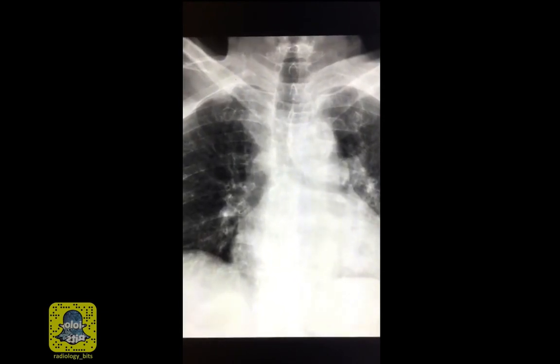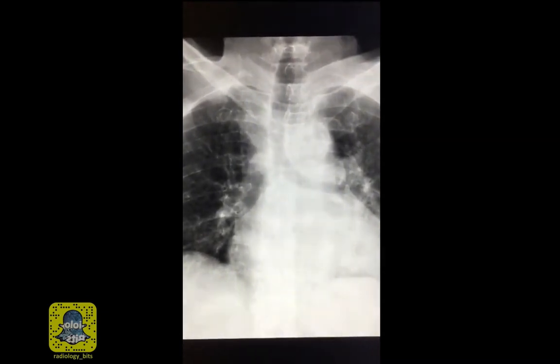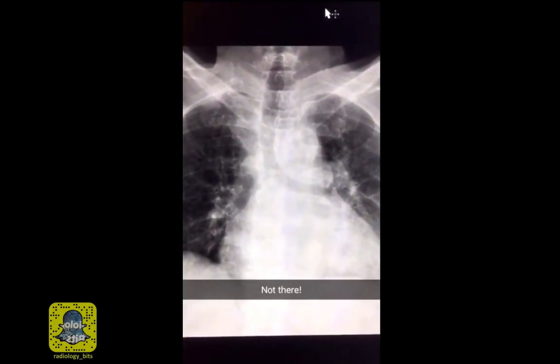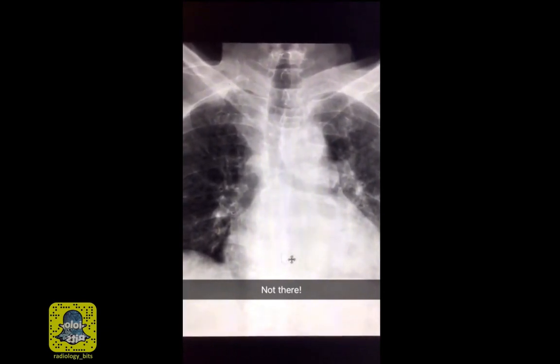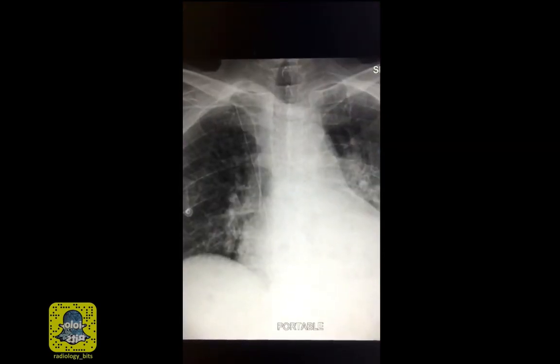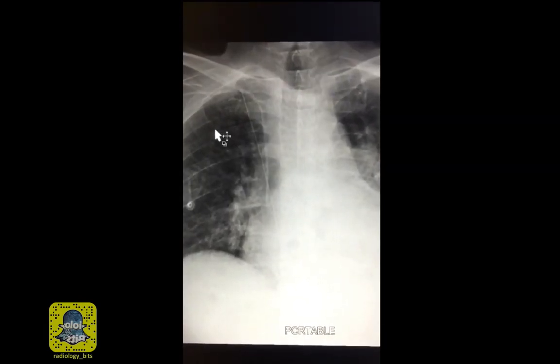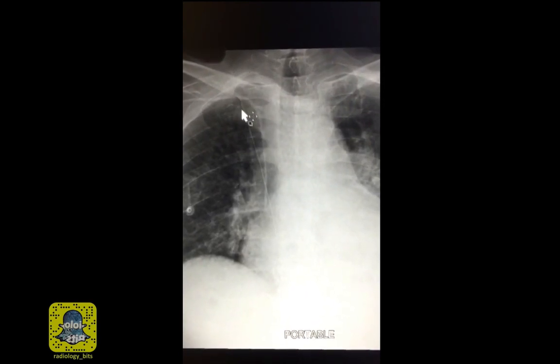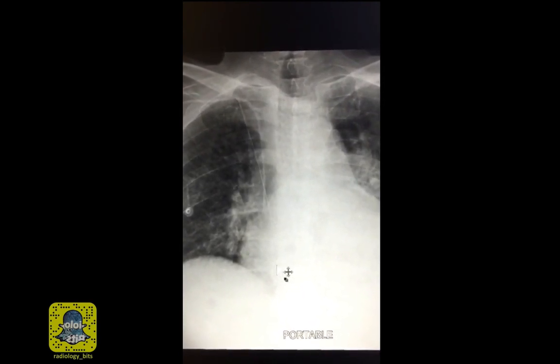To really understand what's going on, let's go back to the patient's pre-admission chest radiograph before he had pneumonia. This is his chest x-ray before he was admitted to ICU, and there are no abnormal metallic densities. And this is his first x-ray after that, when the patient had a rocky course in the hospital. As you can easily appreciate now, there is the PICC line, and there is this abnormal density there.